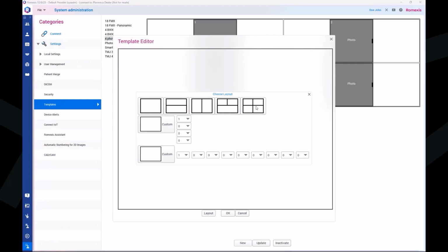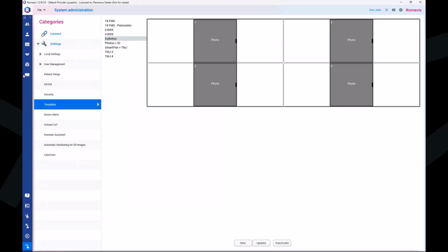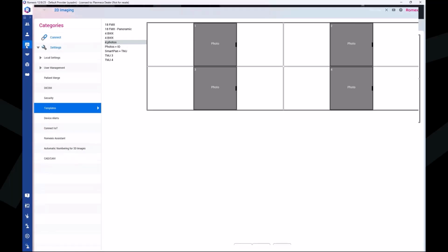They have their protocol on what kind of photos they always capture from the patient. So this is a nice way of creating a layout, a template that they can then always use, and it's easy and nice to add those images always in the same kind of template.